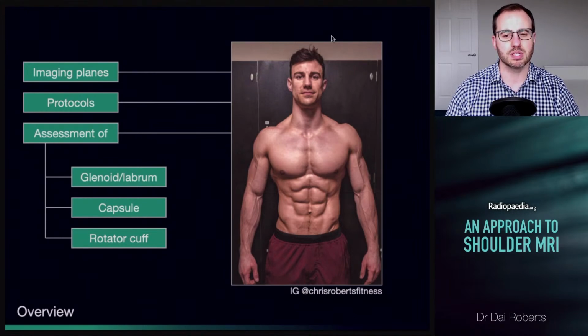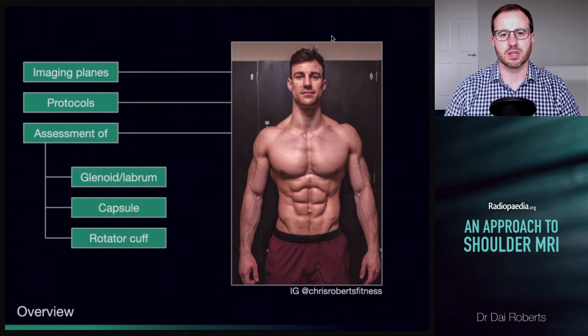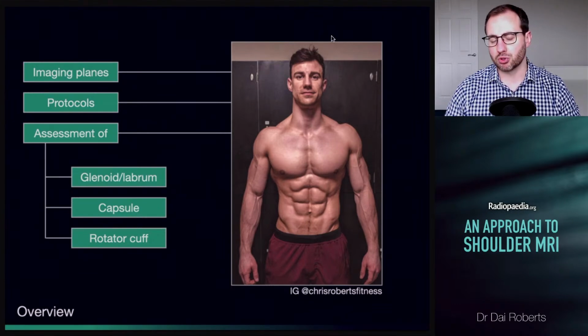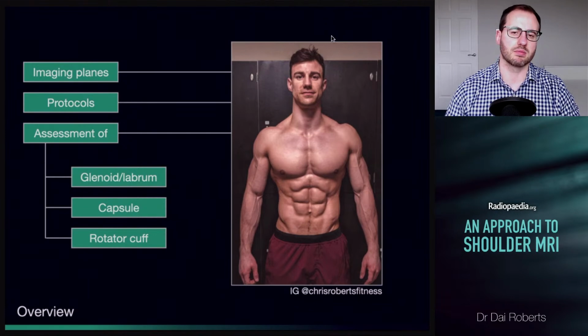He's there to remind us all the most important thing when it comes to musculoskeletal MRI, and that is knowing your anatomy. Everyone has muscle like Chris's in some shape or form, and knowing that and their names along with the other structures of the joints really helps us understand normal from abnormal, and also then we can describe our areas of abnormality in a way people can understand in our reports.